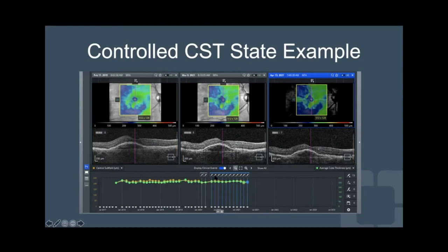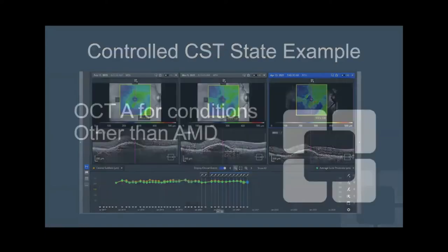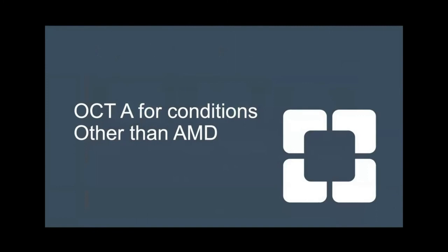And here you can see I gave a couple Beovu injections and a couple Eylea injections, and I achieved a very, very good low central subfield thickness, albeit still with a PED, as you can see in the far right. But again, allowing me to show that I have a nice control. And here you can see on the left side, I'm well below the 250 micron parameter. So that really gives me a lot of assurance, especially when managing these patients with neovascular AMD.